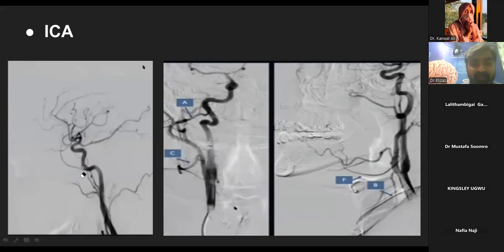Wherever the MCA is going, it's usually the injection of that side. So if this is MCA, MCA is pointing to the left. MCA is pointing to the right side. Okay, you got me there. Let me think.